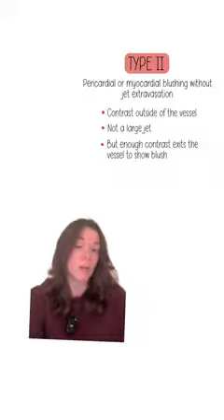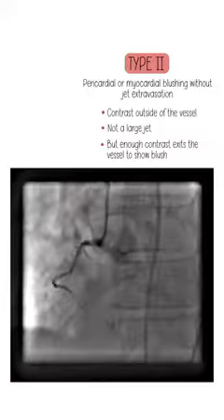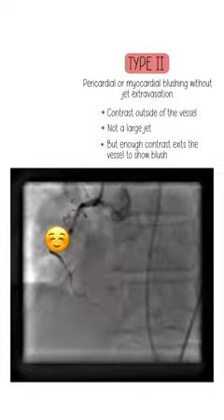That is what type 3 is. So type 2 is that kind of between 1 and 3 where it's not the crater. There was a little bit of blushing, but it's not enough where it was super obvious.